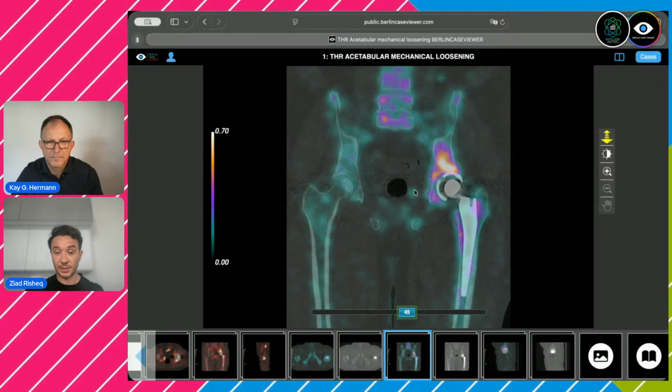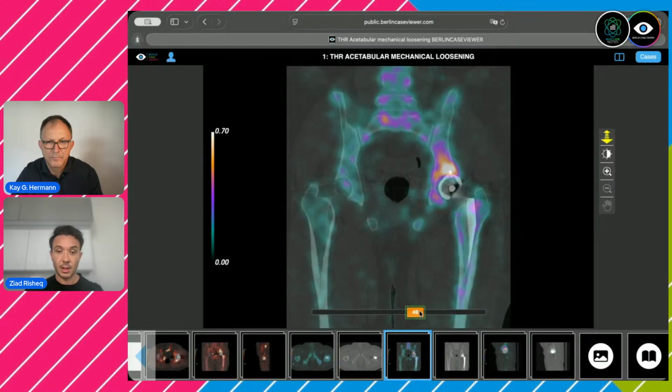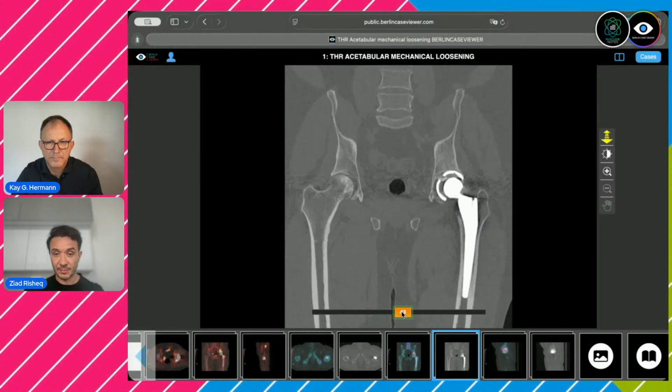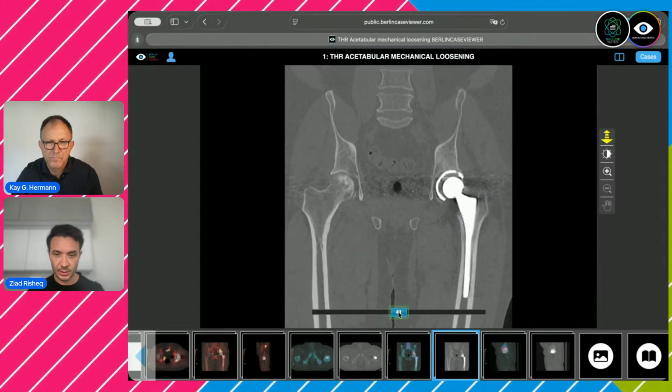So in conclusion, this was actually aseptic loosening of the acetabular component. I say aseptic loosening because if we want to be definite about calling this a septic loosening, we should see fuzzy osteolysis over here. We should see periosteal reaction. We don't really see this; we see regular cystic lucency over the acetabular components. And when you see this cystic line or sclerotic line over here, and you have this lucency, you should really think of aseptic loosening.